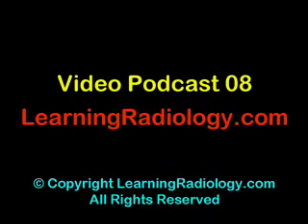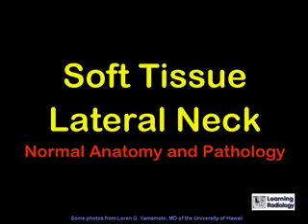This is video podcast 8 from LearningRadiology.com, Soft Tissue Lateral Neck, Normal Anatomy and Pathology.